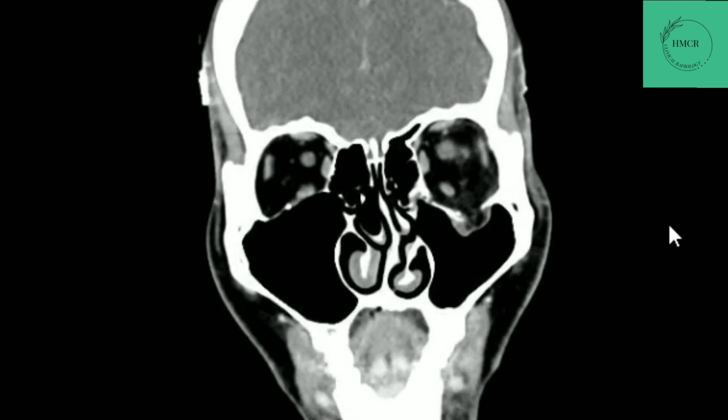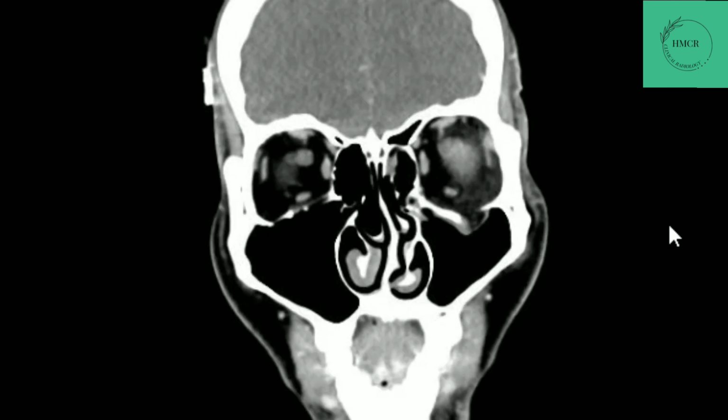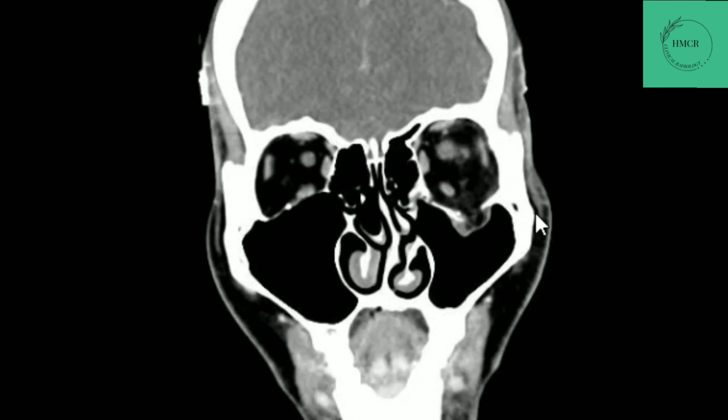This is easily missed if we don't see coronal sections, which may result in irreversible damage to the patient. Another important thing is that this is the site of infraorbital nerve and artery, which can also be trapped within the herniated fat.